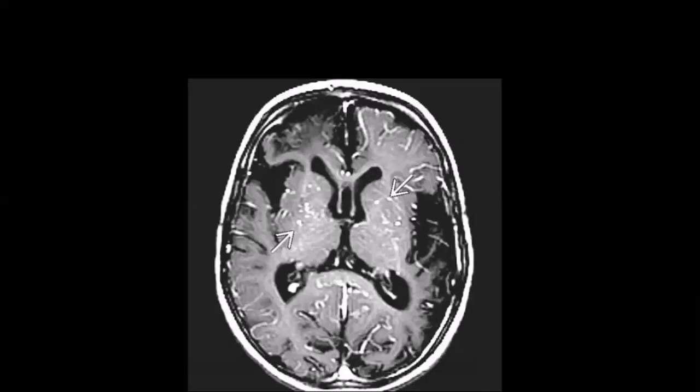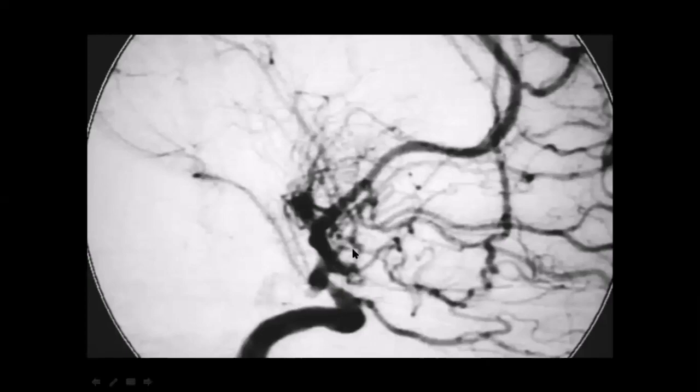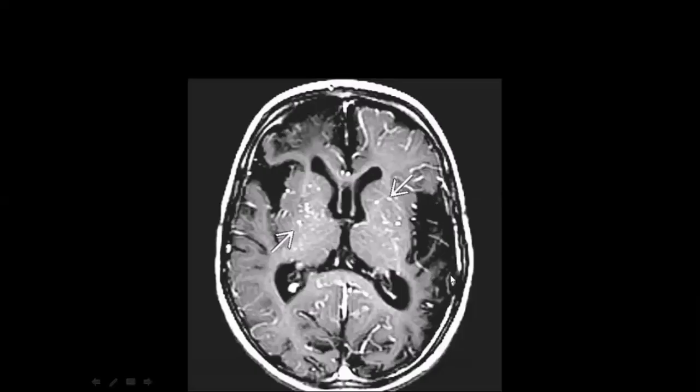So what it could be after you saw the MRI images, it can come to you as a long case, and you will probably have a good history. In the history, if you have clinical data, exactly, Moyamoya, puff of smoke. This is what is characteristic: the puff of smoke. If you see this in the angiography, whoever is specialized in angiography will find that it is very famous. And in this case, you will think about Moyamoya.